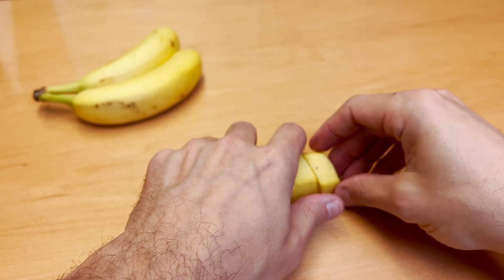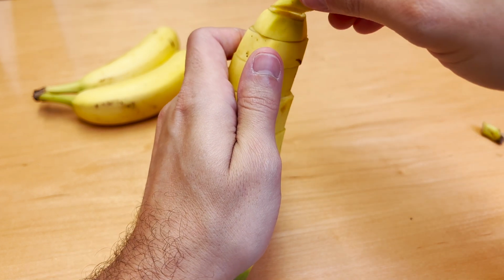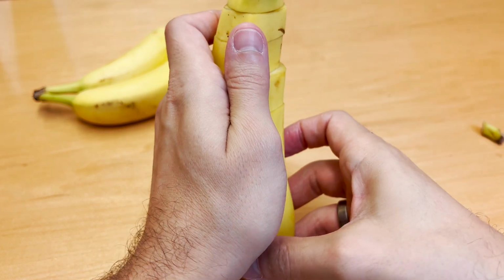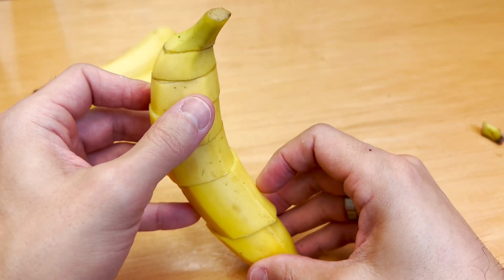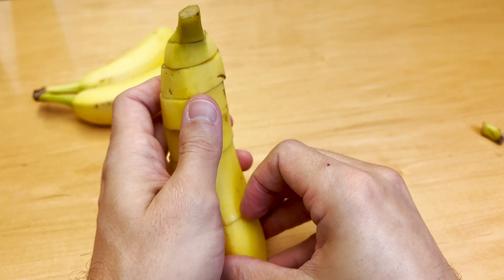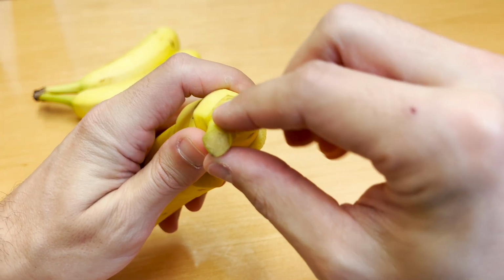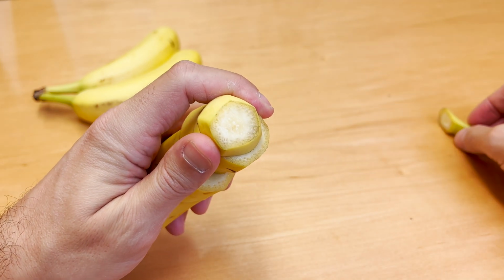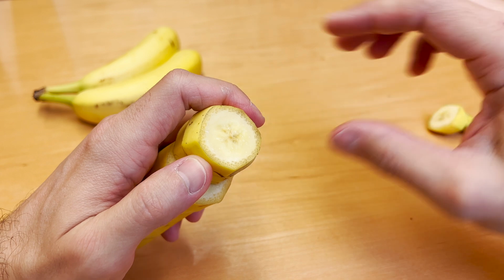Okay, so if we reassemble our banana, okay, I'm going to try to balance this. Okay, so there's the cuts through our banana just like that. And so with the MRI scan, looking at it in this orientation, we can see how our image will change as we move down the banana, just like that.